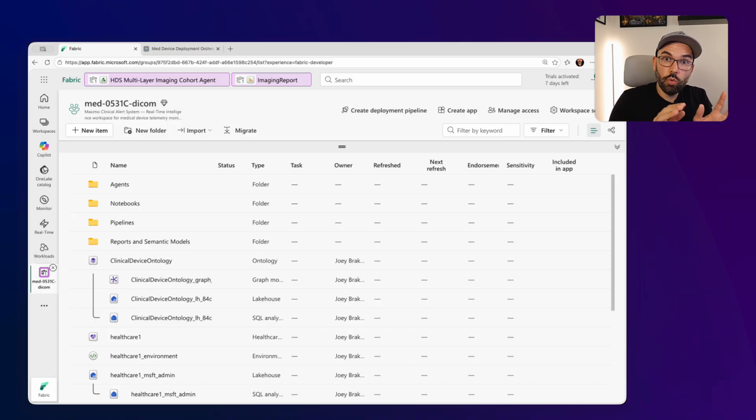But because we deployed the solution, which emulates having data from your PACS and VNA systems, your medical images, along with your patient data from your EHR, like Cerner or Epic or eClinicalWorks or whatever, and puts them all in the same co-located location, the agent can now see all locations together and answer questions and help you cohort and build out some use cases if you're trying to do research.